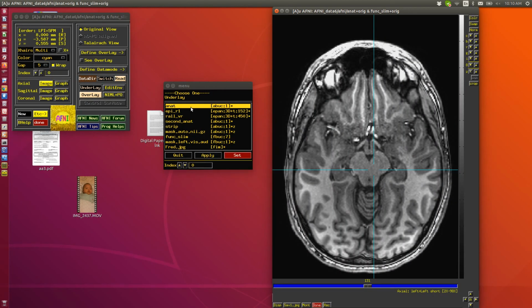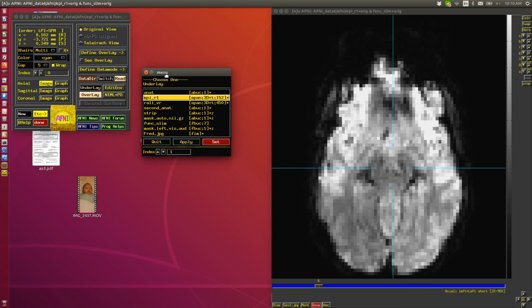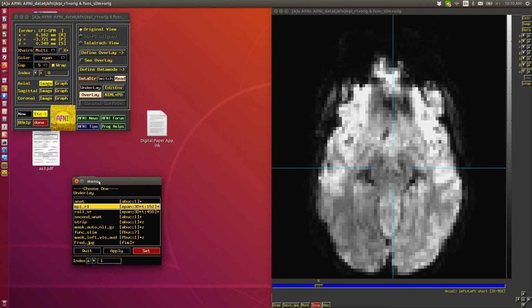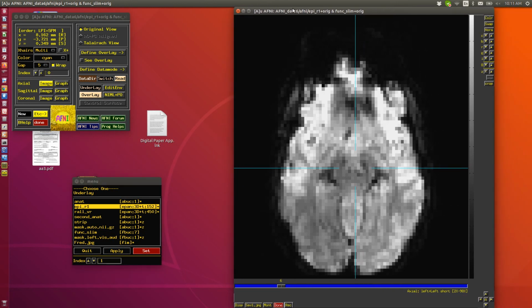That's the default mode of operation, I think now, is you click and it switches immediately. So in space, these things don't look so exciting, right? Unlike the T1s, which I think are frankly remarkably interesting. But on the other hand, they're not meant to look good in space. As I said, they're meant to look good in time. But when I have time, I can make graphs through time, right? Like I had in that image that I showed in the talk.